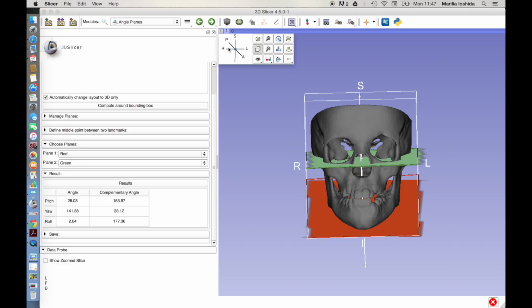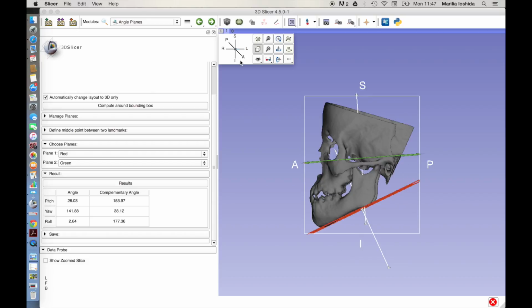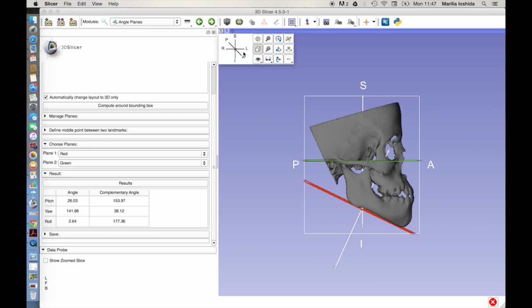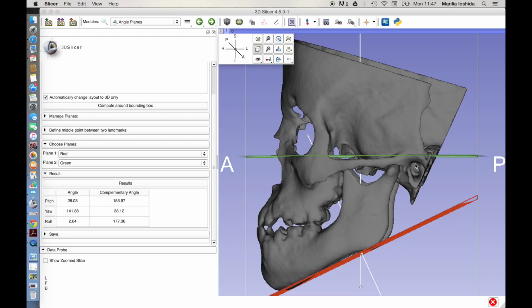Click on the compass to get different views. We're going to move it around again. To change the angulation, click and drag the arrow. Don't forget you can click on the compass to see the different views. We're going to move it around again so it fits this portion of Porion. Seems good on this side, but not on this side, so we have to move it again.